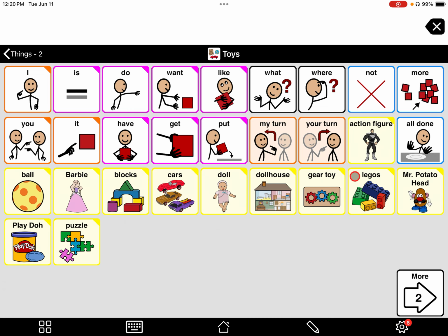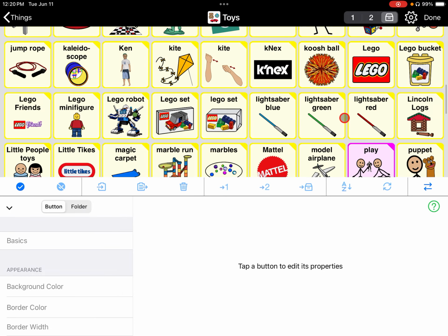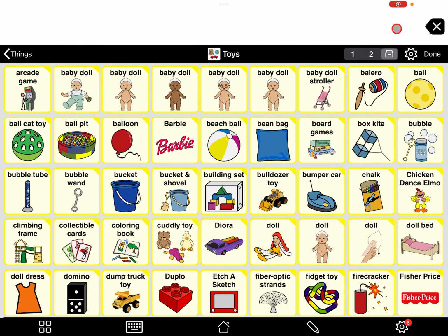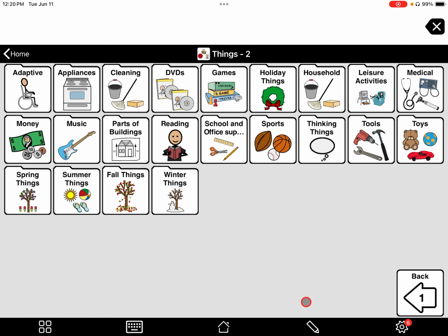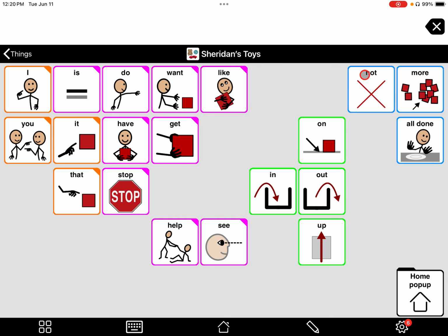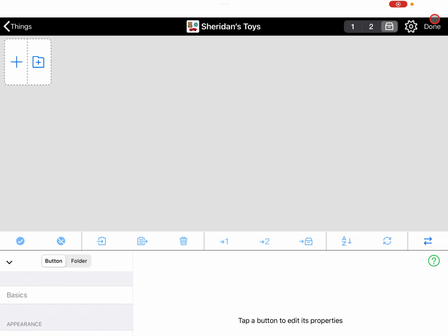And so if we would like to edit this folder, we can click on the folder, and the pre-programmed folders have a lot of icons already in storage. So this is the storage button. So we can easily add all of these icons. If we go back to the folder that we created, you can see that if we edit it and go to storage, there is nothing in storage. So if we want to add a lot of icons at once, it might take more time.